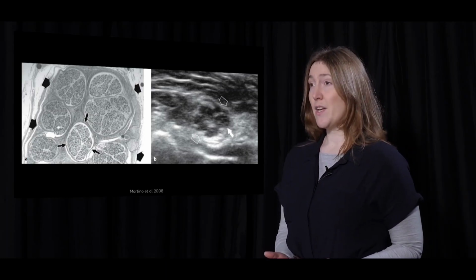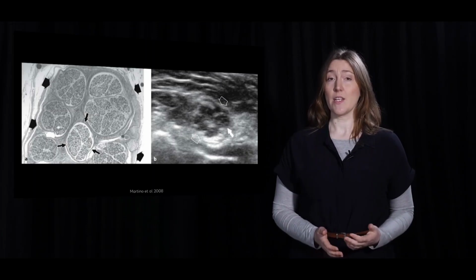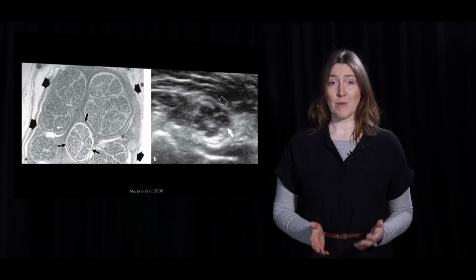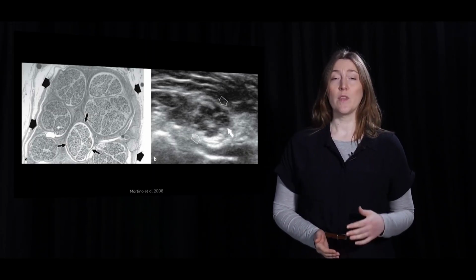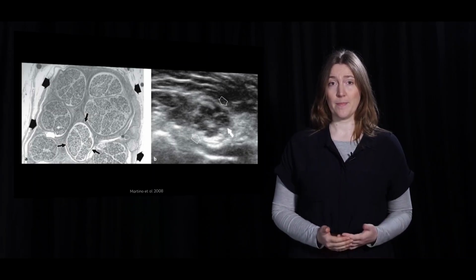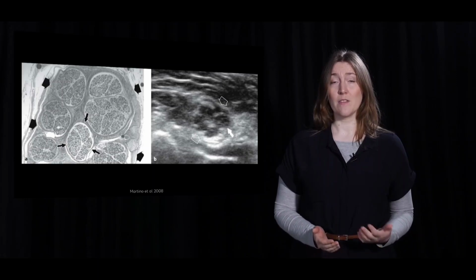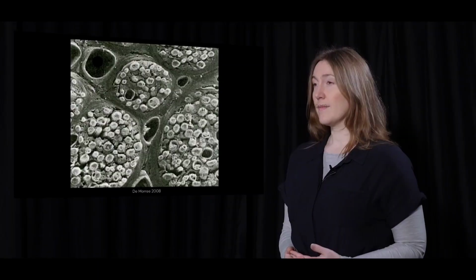See the transverse nerve ultrasound image on the right. The cross-sectional appearance of the hypoechoic rounded areas correlates well with the nerve fascicles seen in the histologic slice in the left image. It demonstrates the cross-sectional appearance of a nerve composed of many fascicles.